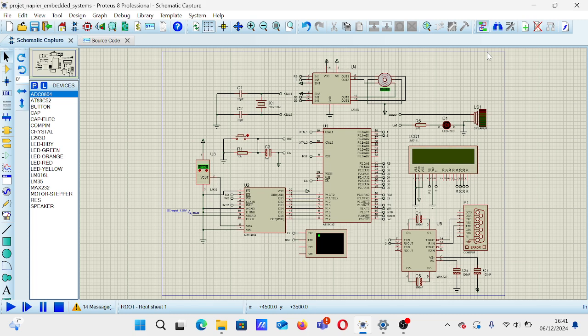Then the assignment requires displaying information to the user during operation to guarantee the transmission of information on temperature and operating time. This is accomplished in the design through two methods. The first one is remote access using a PC through serial communication, and the second one is local access via an LCD screen. For the virtual monitor, as you can see, this setup involves two connections. One for receiving data and another for transmitting data.